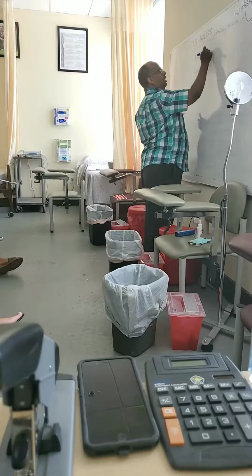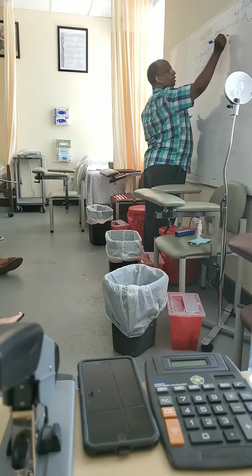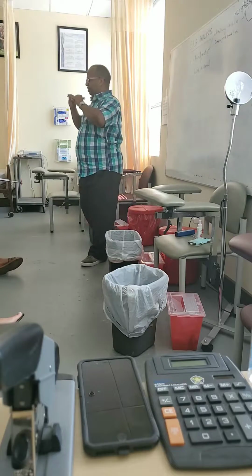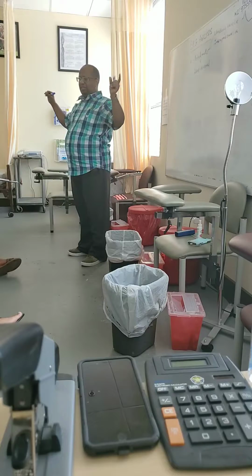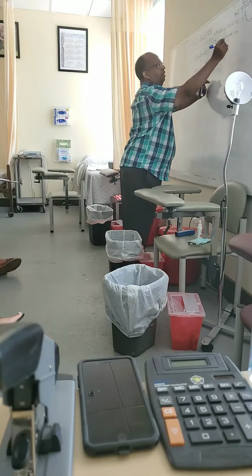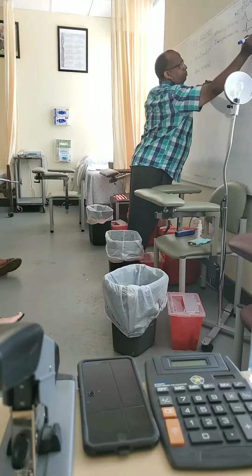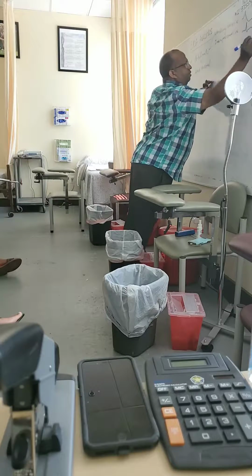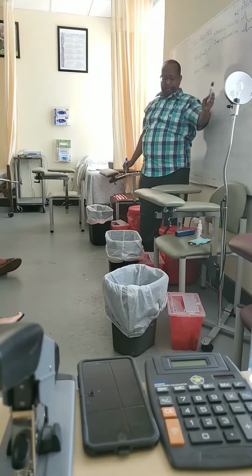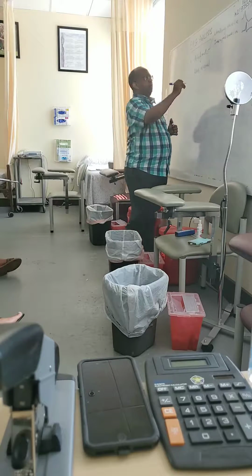The second one is interrupted baseline. The tracing is usually continuous, but in the case of interrupted, it's breaking. Let's say, for example, it's going like this, and it breaks, and then again it starts like this. It's not continuous, it's breaking here. That's called interrupted.